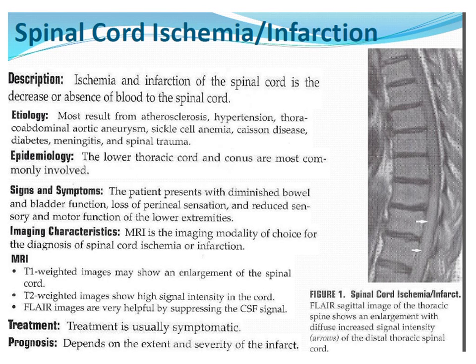It's the same kind of thing that you see on a FLAIR image of the brain when a patient has an acute stroke. Fortunately, this is a little less common than a stroke in the brain, and they may be able to restore blood flow with certain blood thinners and things like that. So if you ever do see that, you want to let the radiologist know so that they can try to get treatment going quickly. It's just like with the brain. The sooner that you intervene, the better. Many times with good rehab and things like that, the patient will be able to restore function.